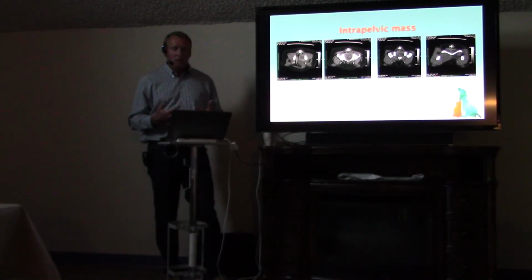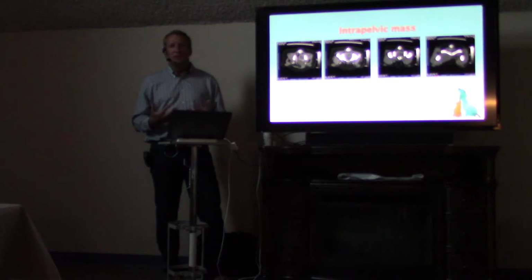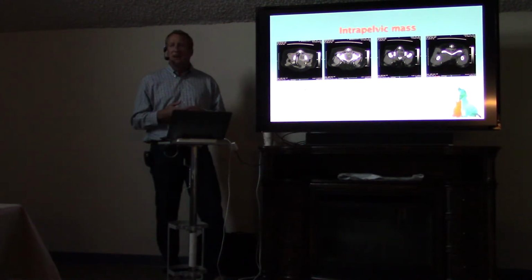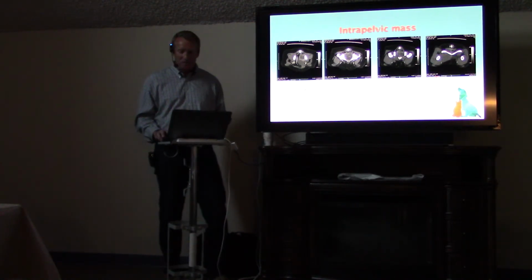The mass was fairly well encapsulated, and they elected to go in and remove it surgically, and the surgeon told me that he got it all. This was not Dr. Kuhlman, by the way. Told me he got it all, but of course you're not going to get margins back there in the pelvic canal, and unfortunately this mass came back fairly rapidly.